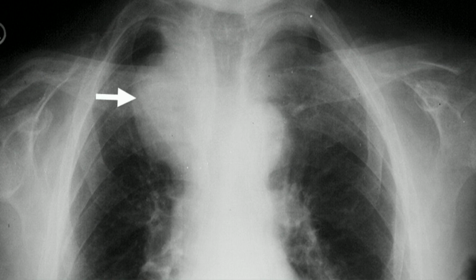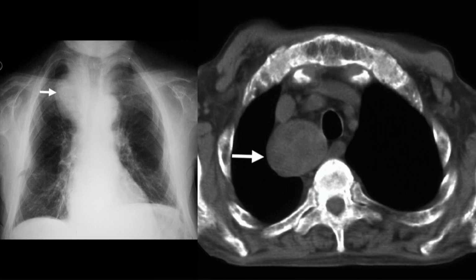So this is a bit of an older radiograph, but it really shows this large mass. And technically, this is widening of the paratracheal stripe. It's obviously more than just the paratracheal region, but that normal line with aerated lung and the trachea, we don't see it. It's been obliterated and in this case, really widened. Here our residents would be right to give a differential, but now you want a CT.